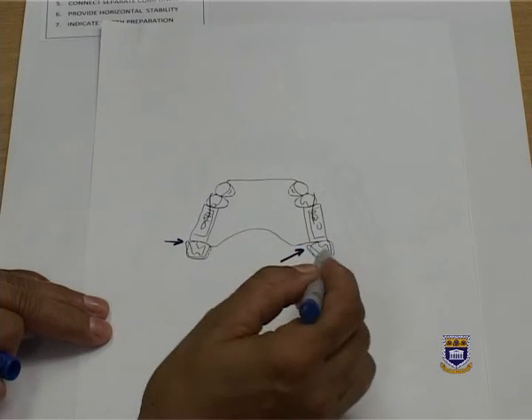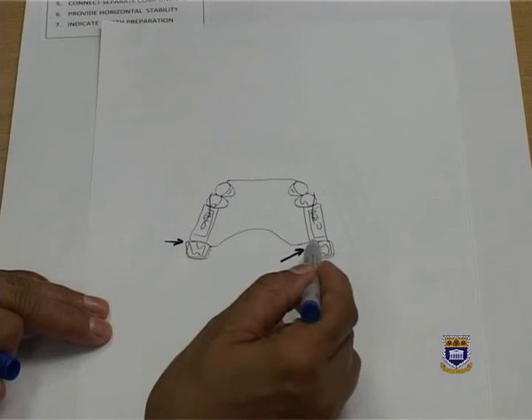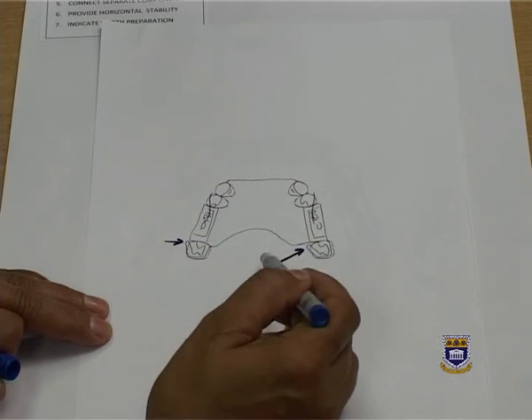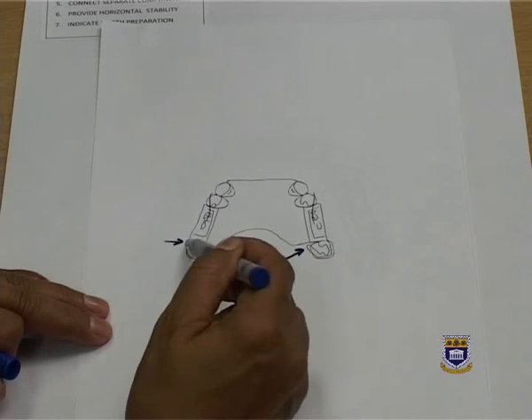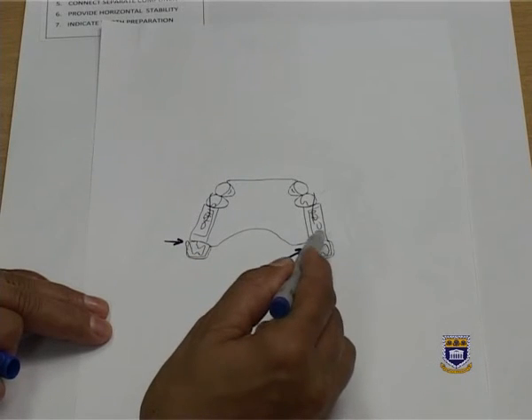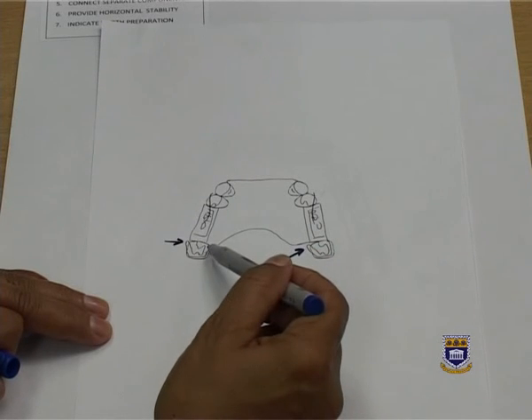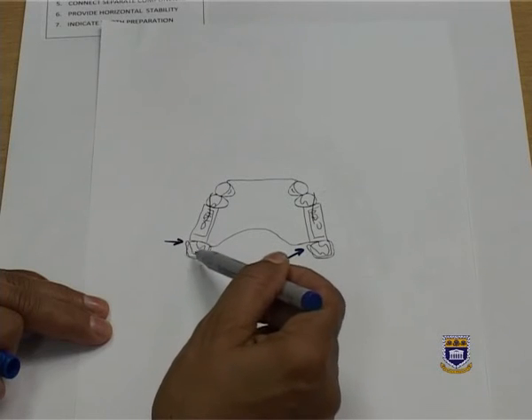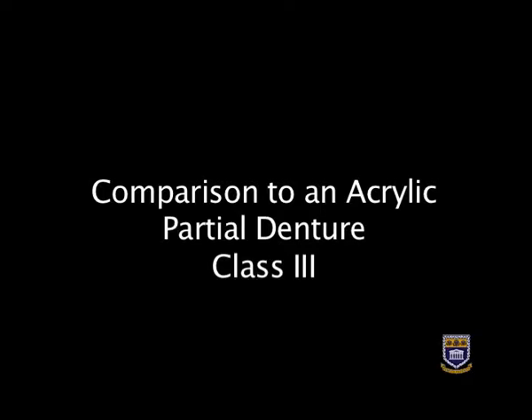In this case, because the teeth were probably mesially rotated, the mesiobuccal and the mesiopalatal undercuts are usually biggest, and the ring clasp can then engage them. Remember, a ring clasp will always extend from the mesial of the tooth and into a mesial undercut. Ring clasps are used exclusively on lone-standing, mesially tilted to mesially rotated teeth. So these are different designs.